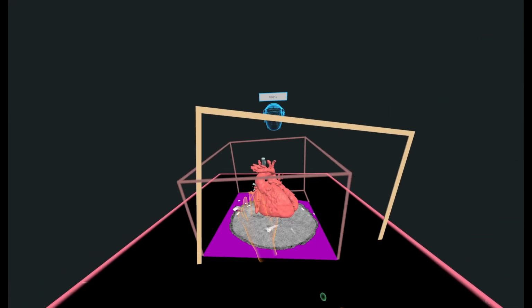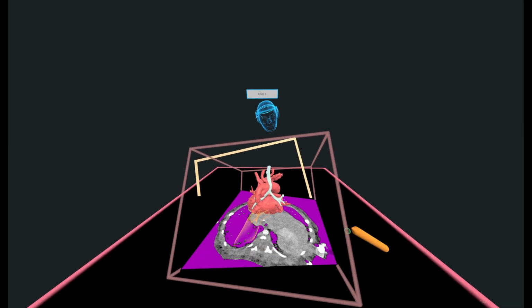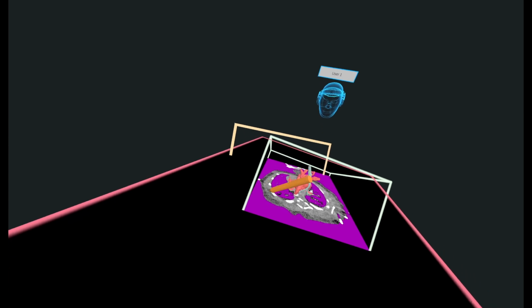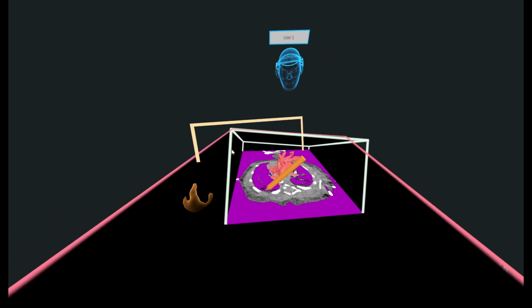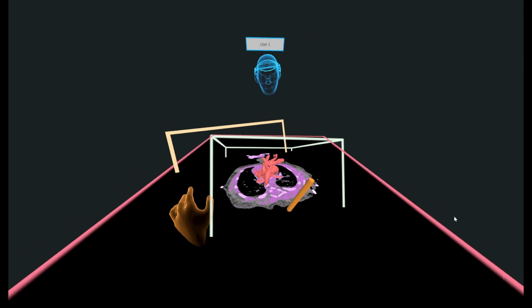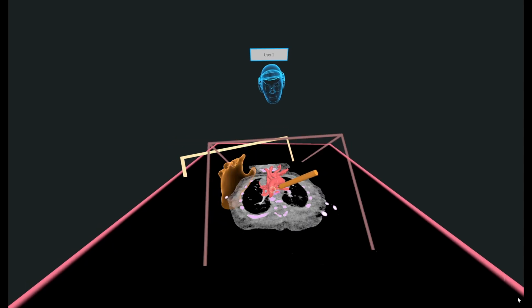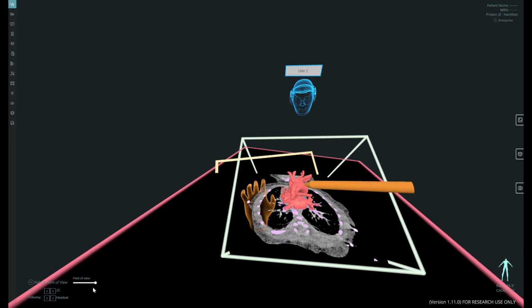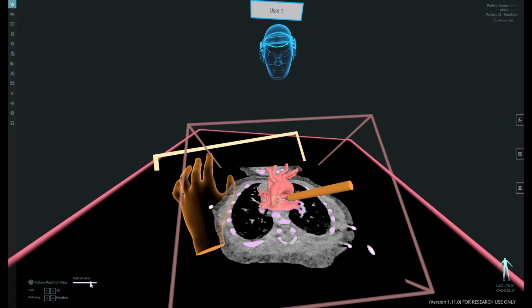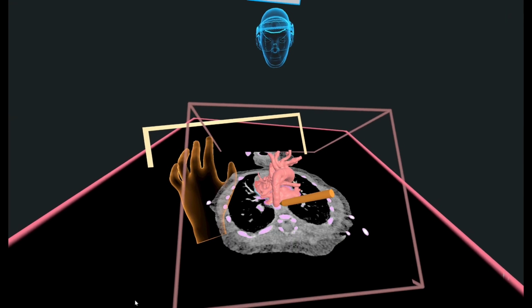And this is what I like to see, the anatomy of the airway along with the rest of the heart. So I'm going to segment some more of this heart, especially the aorta. For that, I'm going to have to change more to the contrast area. So it were right there. I'm going to segment the aorta a little further. I have to select the structure that I'm working on, and that makes you work on that one segmentation.